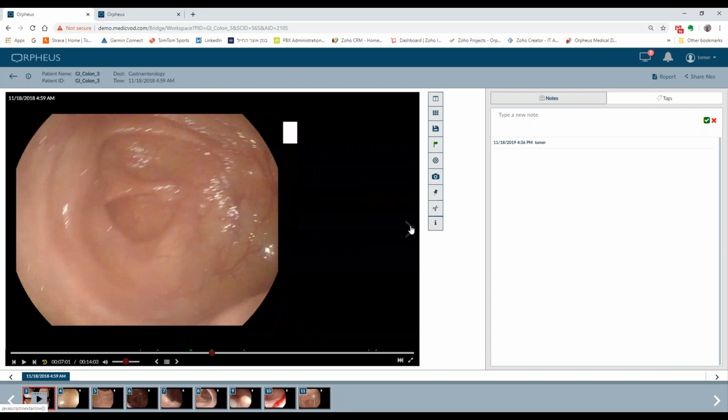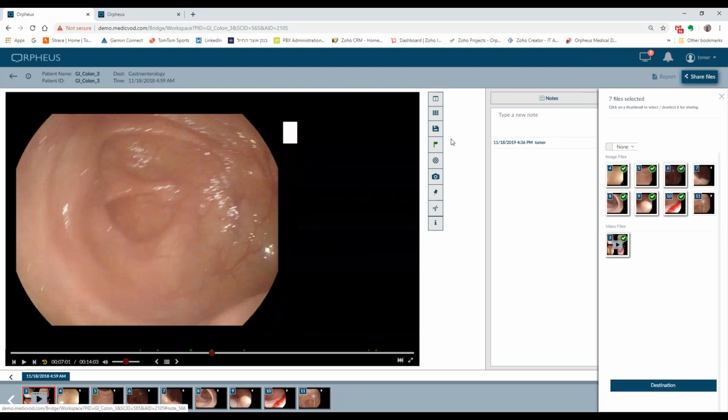With video, I think the most common actions would be either to edit it, of course, crop it, or trim certain areas of it, and of course to download and share it, whichever way you want to do it. You can direct download a video here, or select it from here and download it here as well.